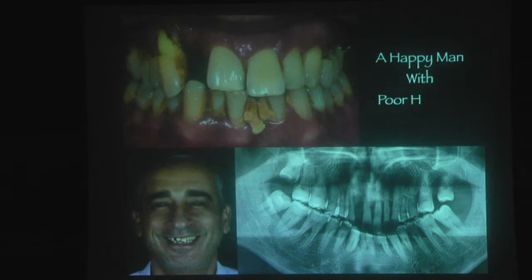As you can easily see from the OPG, there is very severe bone loss, and there are so many mobile teeth inside the mouth. Generally, patients come to our clinic and want everything in the same session, the same appointment.